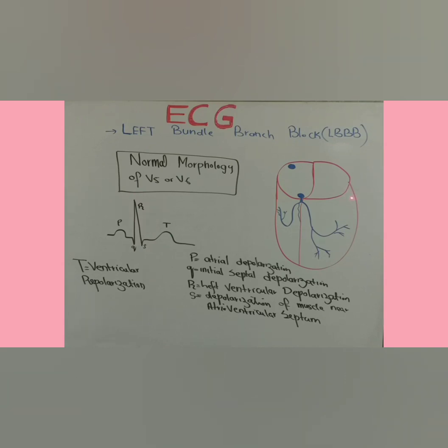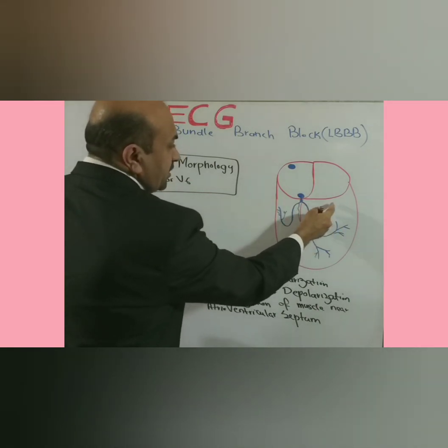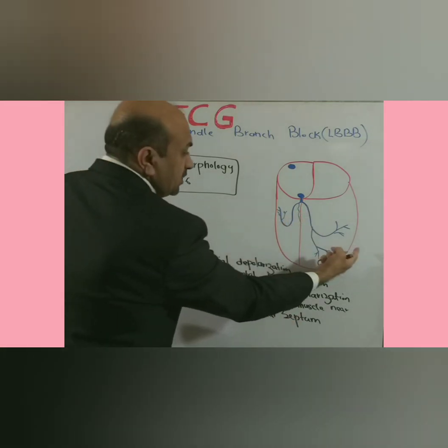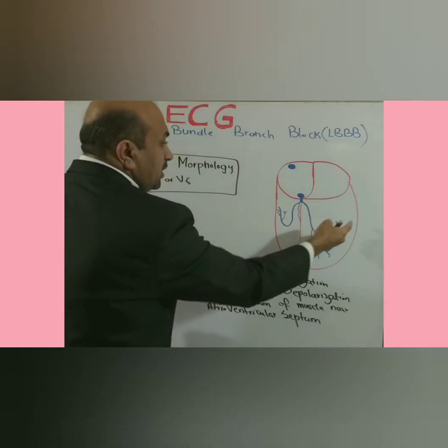All those ventricular muscles which are located near this part, near the septum which separates the atria from the ventricle, this is a dead tissue. After striking here, the waves of depolarization will die down. But here V5 and V6 are located. They look at the wave of depolarization of this part of the myocardium going away from it.